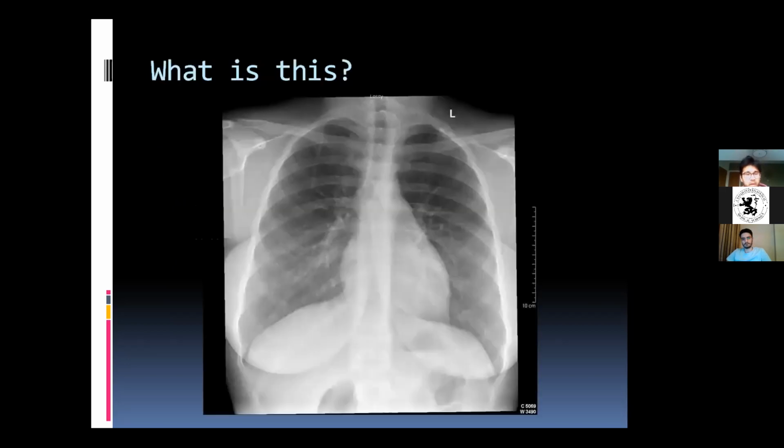Okay. What do you see here? Anyone tell me? Yeah, good. Well spotted. But what is the abnormal feature, if there is any, that you see here? It's a very, very rare finding. Don't think of it. You will cause yourself a lot of trouble.